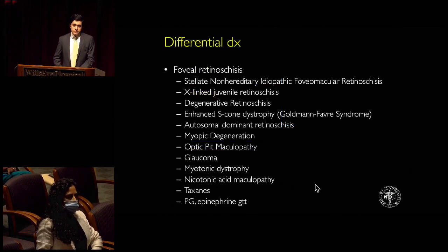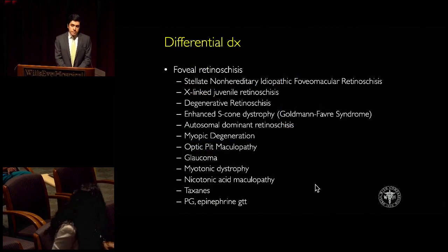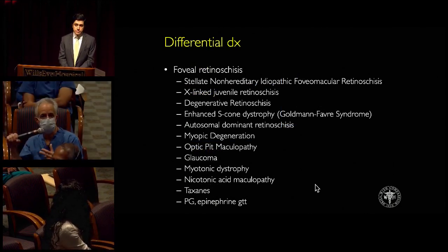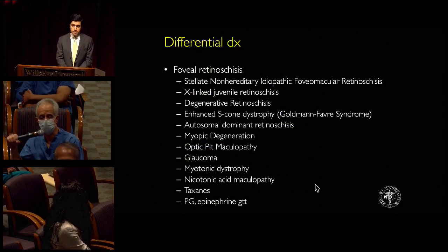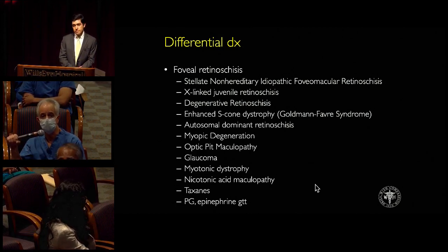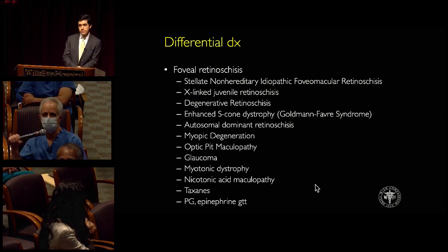When I first see an OCT and you see cysts, the first thing I think of is, is it thickened or not thickened? There are atrophic cysts, which implies a neurodegenerative process, something like MacTel and so forth. And then there's cystic thickening, which is what we have here, and that may or may not be exudative. So you're nicely describing this.